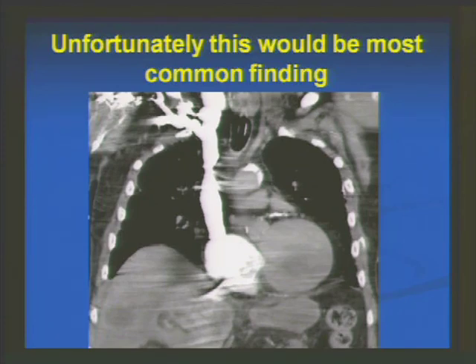If we were to image everybody with traumatic aortic injury, this is the typical finding. Actually, we scanned this patient in our department, I'm embarrassed to say. This is what a CT scan looks like in a patient whose heart is no longer beating. You can see all the contrast going through the right heart into the liver and actually into the kidneys. So I hope to drive home the point that most of the patients that have these injuries in the field don't make it to the hospital.